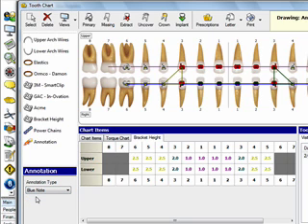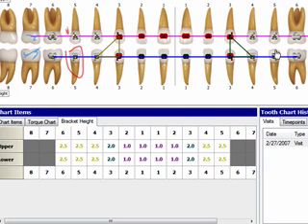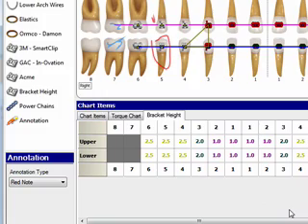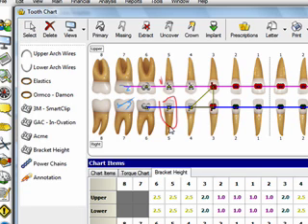or drawing tools. I'm going to pick my blue note, and blue would mean something for you, and I'm going to draw some blue information here and here. And then maybe I want to go make a red note right here and right here. Maybe I want to circle this tooth and this tooth in red. And you'll come up with your own terminology of what blue, red, green, whatever you choose to configure as your annotation.